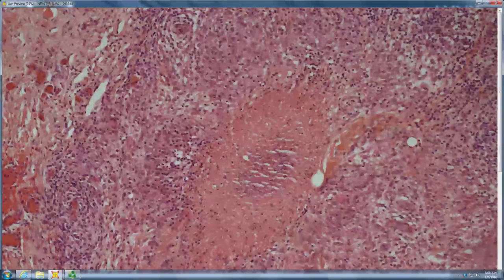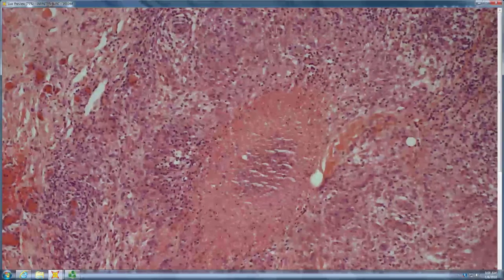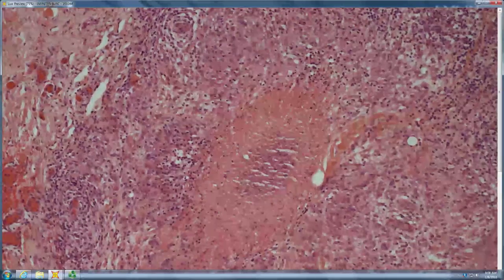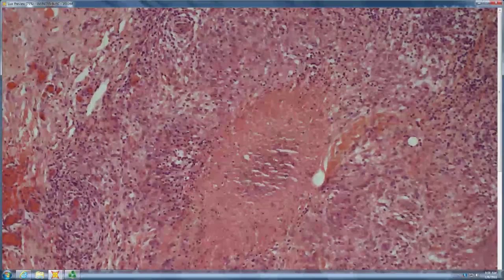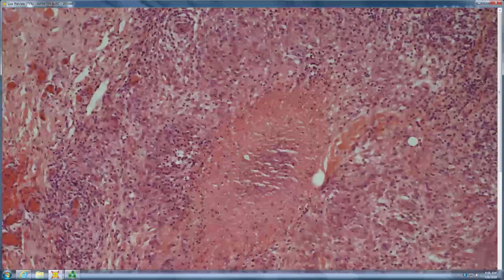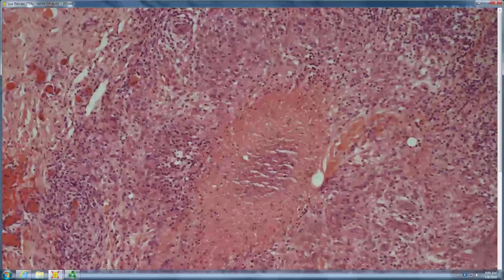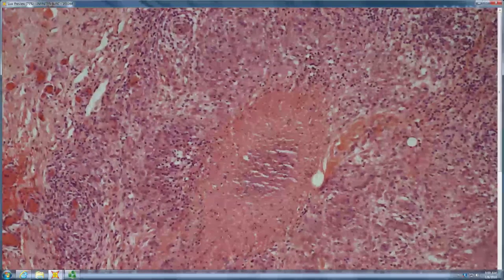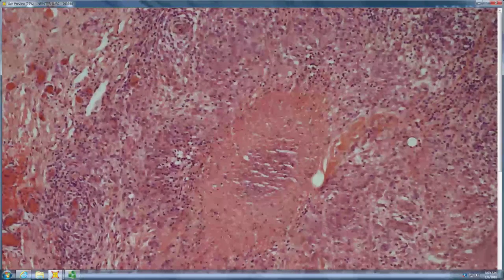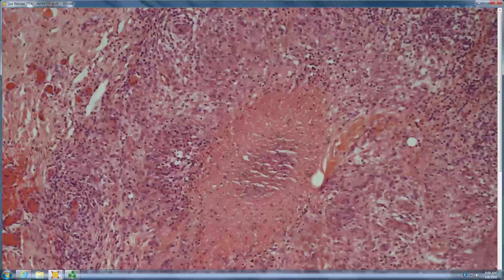Yes, neutrophilic debris is present. You got it right, even though it was the first choice. Good for you. About the only time you see that in tuberculosis, you don't see it in granulomatous disease like miliary TB. You're not going to see neutrophils, but you will see it in scrofula. You will see it in the periorificial TB. So those you will see neutrophils.